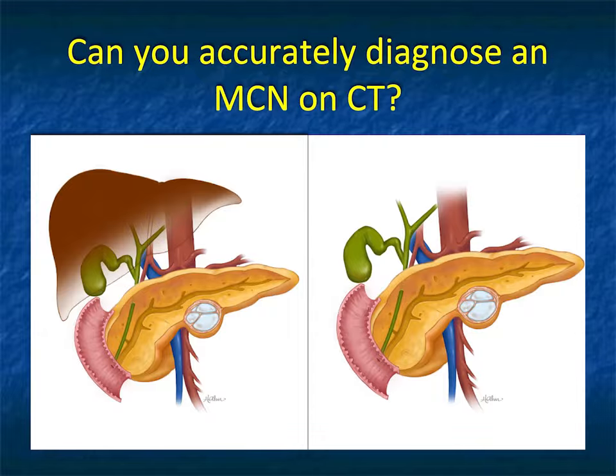So I've now gone through a lot of cases of MCN. We talked about the appearance and location, body of pancreas, female, age 40, rim-like calcification at times, no dilated pancreatic duct. You can see distal glandular atrophy. You look for nodules and septations and enhancing walls, all of which become features suggesting high-grade dysplasia or malignancy. MCNs are premalignant lesions. Essentially, all recommendations to date are any size to remove them to prevent development of cancer.